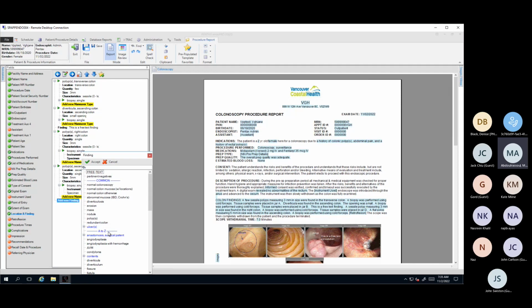I can search for all data where there were 3 or more polyps, or where there were sessile polyps, or let's say there was a mass. Whatever you type in, provided those keywords are there and spelled correctly, I can search the database on a bunch of keywords as well.